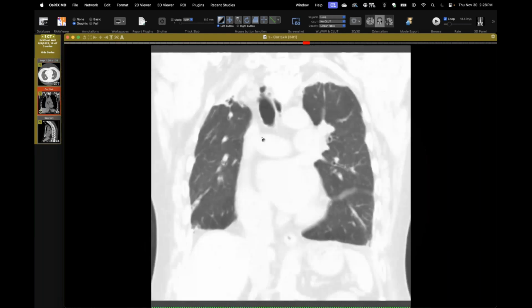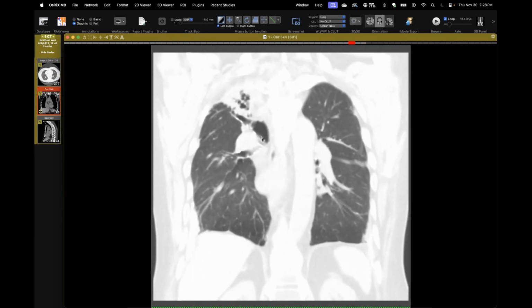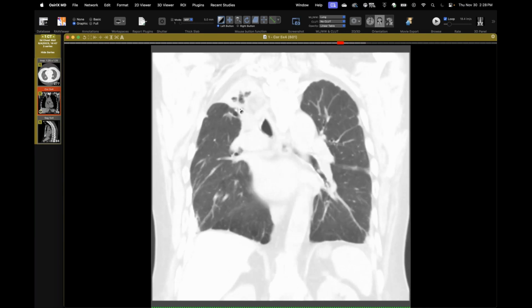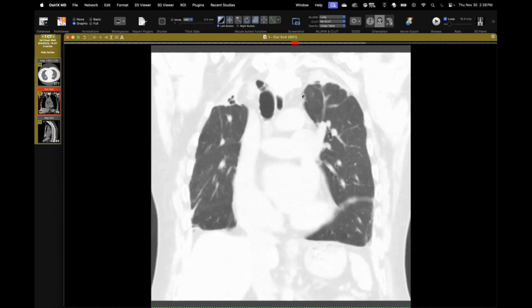And this, I remember, it's taught a lot in studying for boards. Residency is upper lobe fibrosis. Think of Ank-Spon, but over all the years, I've never come across a real case. But this patient indeed has this. It kind of looks like pleural parenchymal fibroelastosis. I don't know if that actually is, but it's that distribution, upper lobe. You can see the left upper lobe is less involved.